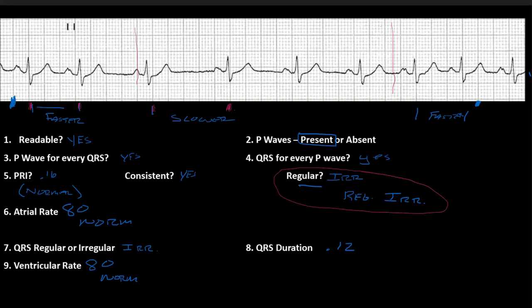Because of that and everything falling within normal conducting pathways, we are then going to call this a sinus arrhythmia. Okay, so it's a sinus rhythm because we have a P wave, and it is going to be an arrhythmia. Okay, so a sinus arrhythmia, really, some of the books are going to tell you that there's a couple different things, or really two areas that you're taking a look at, that this could be related to respiratory rate. So somebody is breathing. And because the EKG leads are on our chest, and you know that you're going to be moving up and down every time you breathe, it is picking up the pattern of your respiratory rate.